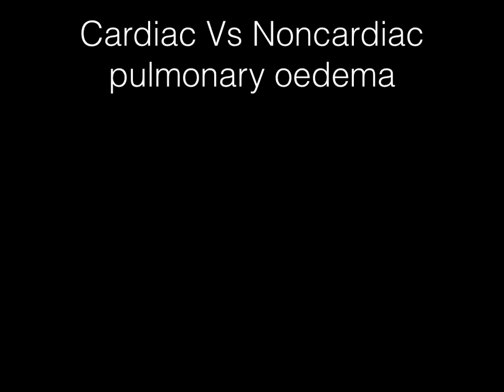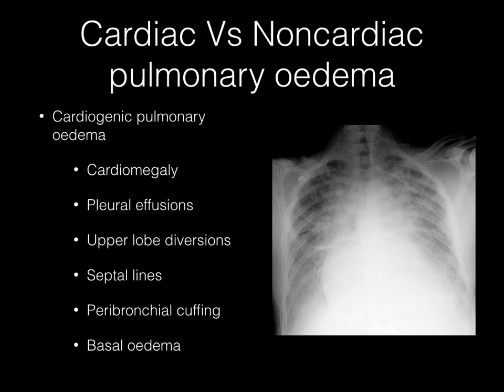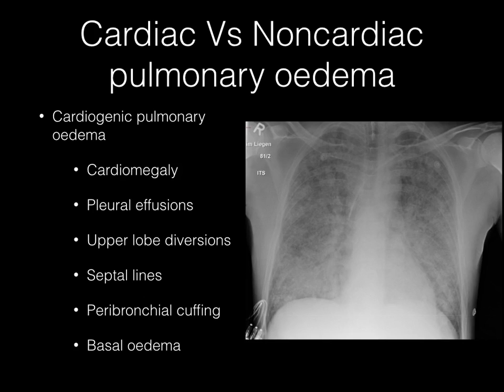But there could be a number of other reasons why a patient might develop a similar pattern with non-cardiogenic pulmonary edema, like for example, in patients with ARDS.